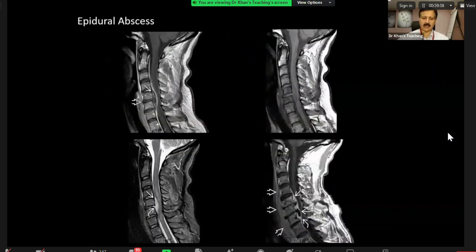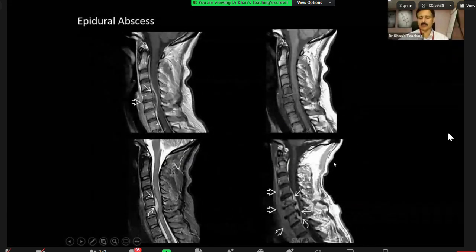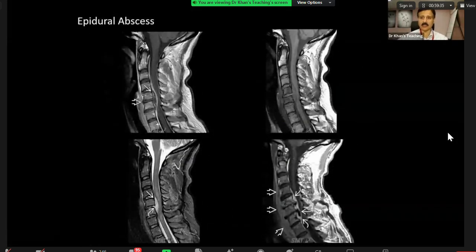And here comes the same point from StatDx. You see here, the dura is enhancing, there is a bit of phlegmon. Within that, on this T2, if you see this portion here, which is not enhancing, you will call that portion an abscess, because the clinician will ask how big it is. Then you can measure this component. Don't measure everything else. When you do a rescan, it might enlarge in size because it might liquefy. On the other hand, because of antibiotics, it might reduce in size.